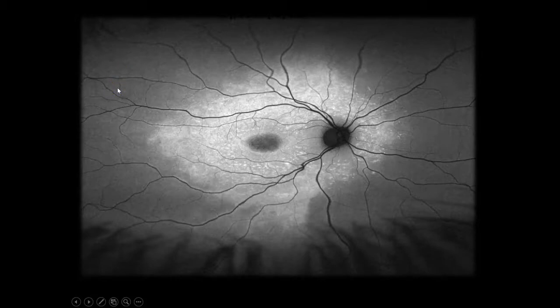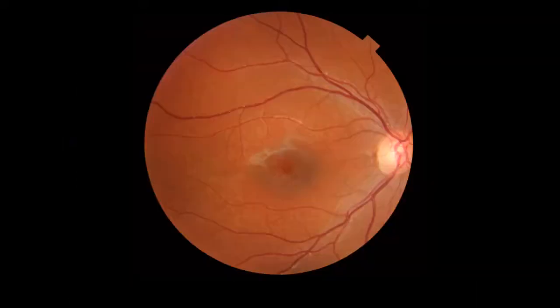It started about 20/30, went to 20/50, 20/100, 20/200, seen by, according to mom, 15 different doctors, and they all looked at him and said that he's okay. This is what it looks like clinically. You don't really see very much, maybe a couple of tiny little white spots, but the clinicians who saw him previously, months earlier, years earlier, always thought he was okay. He may have been just hysterical and malingering.